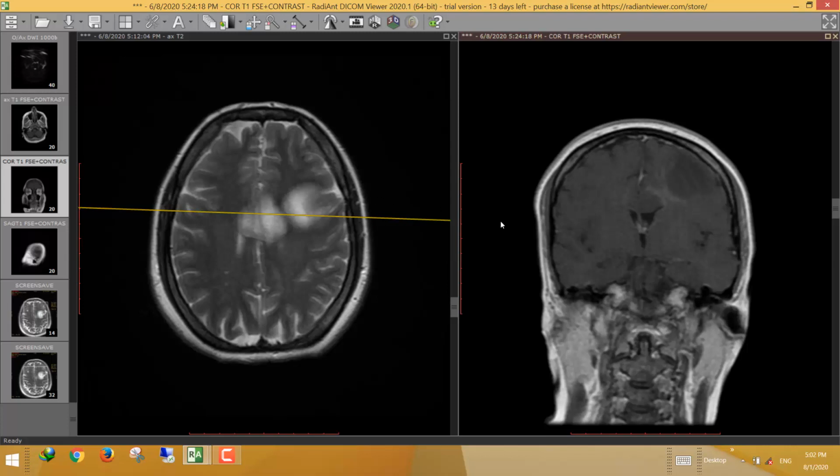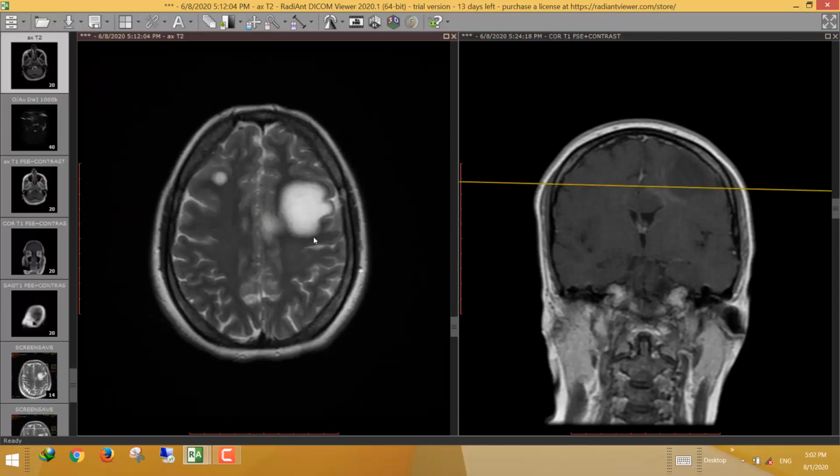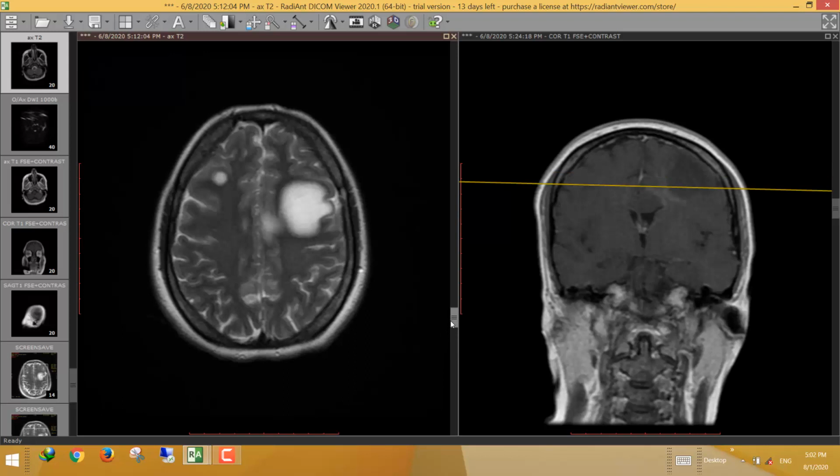So in the post-contrast images, this makes the possibility of a demyelinating process or tumefactive MS the most likely diagnosis in this case. And if we review the T2 pattern of such lesions, the bright T2 signal at the center of the lesion usually occurs in tumefactive MS. We also notice some sort of linear traversing structure here.